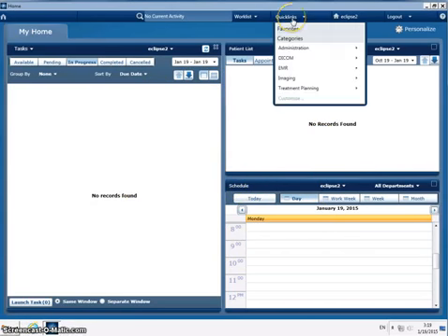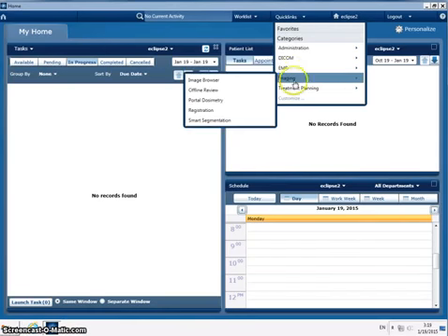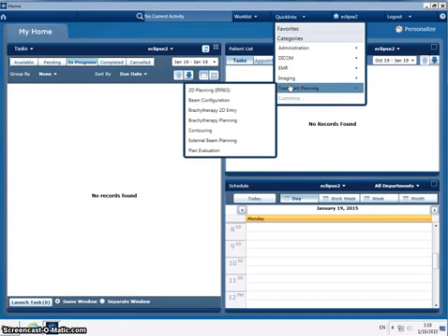So the area we're interested in is these quick links here. This is going to take us to the modules that we want to use, and you can see there's a number of different modules which do lots of different things. The two that throughout the course we'll be interested in are these two, the imaging one and the treatment planning. For today's purposes we're interested in the external beam planning one, but as you can see the rest of them are fairly self-explanatory. So if we were doing some brachy planning, clearly we'd go in there. If we wanted to do some contouring, we would go in there.